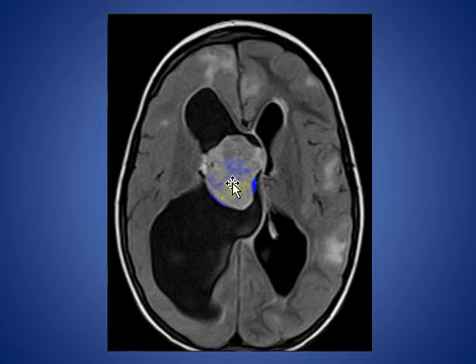This is a subependymal giant cell astrocytoma. And we see here abnormal signal intensity in the subcortical region, here in the frontal regions, and these are consistent with subcortical tubers in patients with tuberous sclerosis.